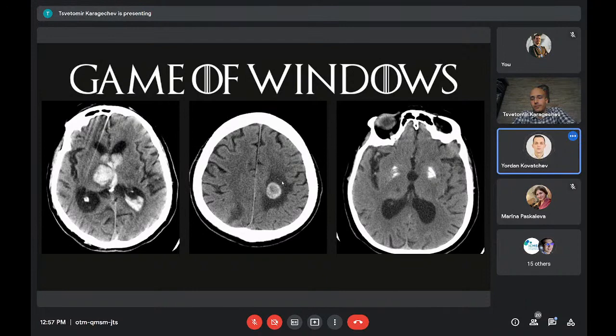how big it is. And in the case that I showed you earlier with the renal cell metastasis, it takes a lot of time, it has been there for a long time until it causes symptoms. It has been there, and edema has developed, and so on. So really think about that. When you see big edema, think of something that has taken a long time to develop, so probably an underlying neoplastic process. Exactly, and as Dr. Kovatchev showed you in his last session, in this case, give contrast. So look for something else.